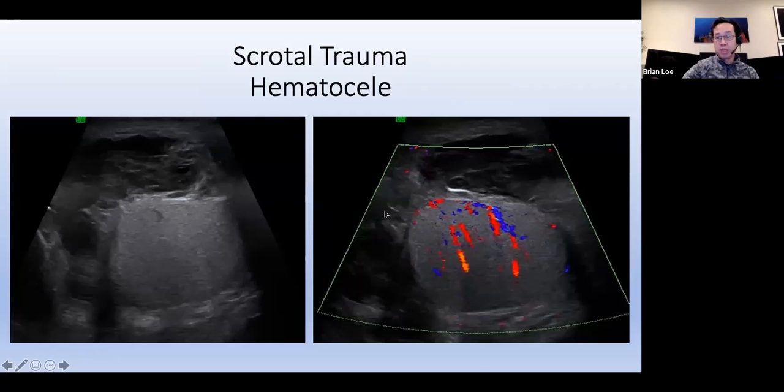Earlier, I showed you a pyocele. This is a hematocele following trauma. You see how much they look alike, but again, hematomas have a very classic appearance in the initial phases because it is composed of very complex fluid, of course, and as it matures, you start developing these fibrinous strands, and it has these septations in it, and the blood products have variable rates of degradation into more cystic components where it's more fluid, but also semi-solid, clot still. So this is a hematocele surrounding this testis.